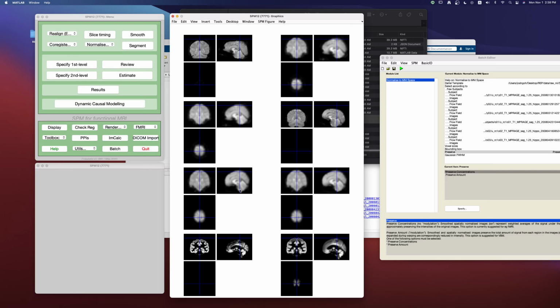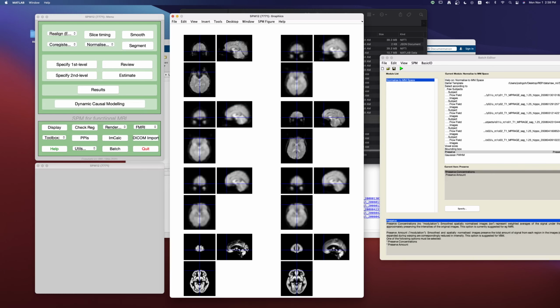And note here, this is the SST. The SST is kind of in the middle. It's not really the TPM, nor is it the subject. This is the mean image for the 6 subjects that we have tried the processing on. And here, just to show you again, it's the same thing. This is the older subject in the native subject space, and then the normalized and smooth older adult subject, which is matching the TPM pretty well.